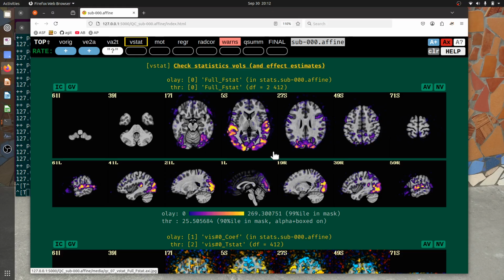Single subject data is noisy, so we find it useful to see what the noise for a given subject looks like. So this amount of stuff outside the brain isn't particularly disturbing. Some of this may be related to draining veins, eye blinking, and things like this. But within the brain, we see a lot of regions we expect, particularly in gray matter.